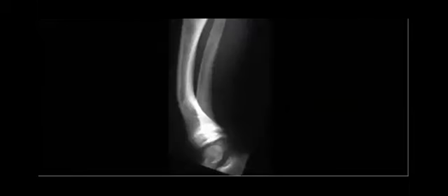Then maybe you can mention that with this bowing appearance, if this patient is in the pediatric age group but is older, then think about something not related to rickets as a first differential, like something from the causes we mentioned.